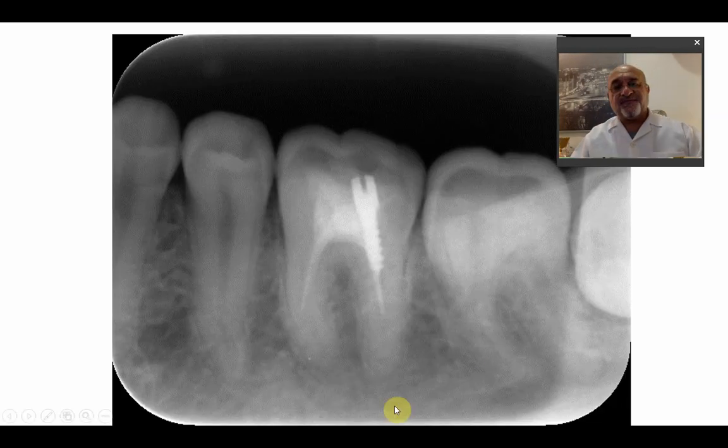In the premolars, of course, you know the premolars from their shape, from the number of the roots, cusps, and we usually have the images of the premolars come also the same with the images of molars, because of the size of the film. And the most important structure that you would expect to see, anatomical landmark I mean, in this area is the mental foramen, which is the exit, the end part of the inferior dental canal.